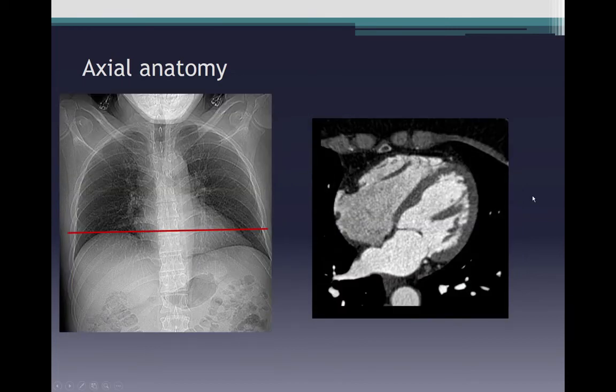Okay, let us go back to the center of the cardiac chambers. So coming back, now we can see the two ventricles, the two atria, the trabeculations in the right ventricle, the papillary muscles in the left ventricle, the two leaflets of the mitral valve. Now, the leaflets of the tricuspid valve are generally quite thin and less visible on the CT scan.